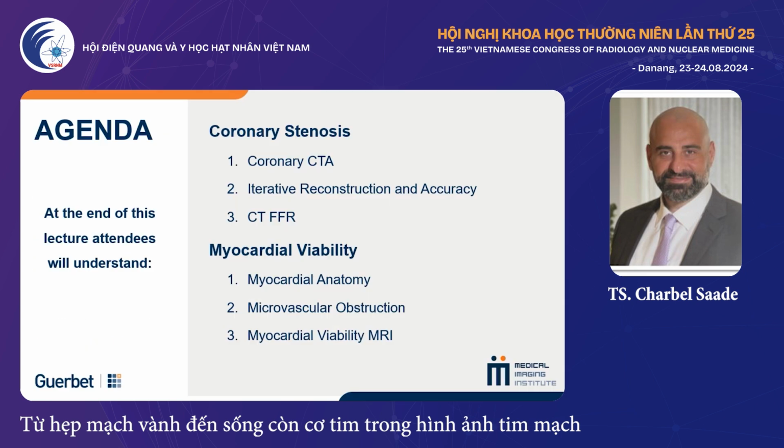So in today's lecture, we'll talk about a little bit of coronary CTA, the impact that accuracy has on iterative reconstruction, CT FFR, and then we'll go into myocardial viability, anatomy, microvascular obstruction, and viability, and just show how it is not all as simple as what we think it is.